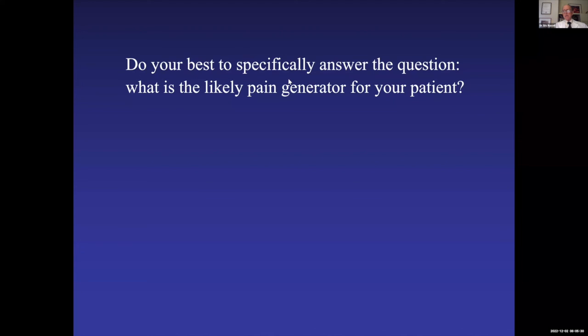And obviously, if you have a fracture that's acute, the MR study may show edema, and that may be an excellent clue. Same thing with other fractures around the posterior elements. I actually had an odd case recently.